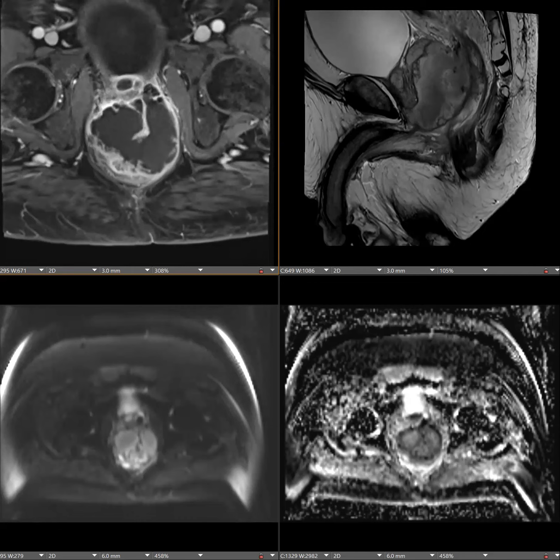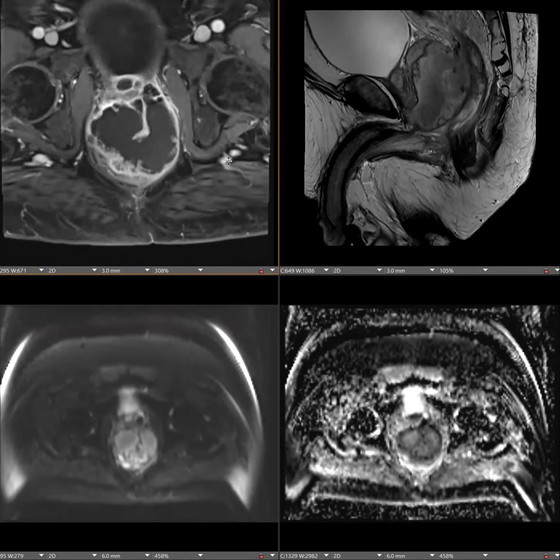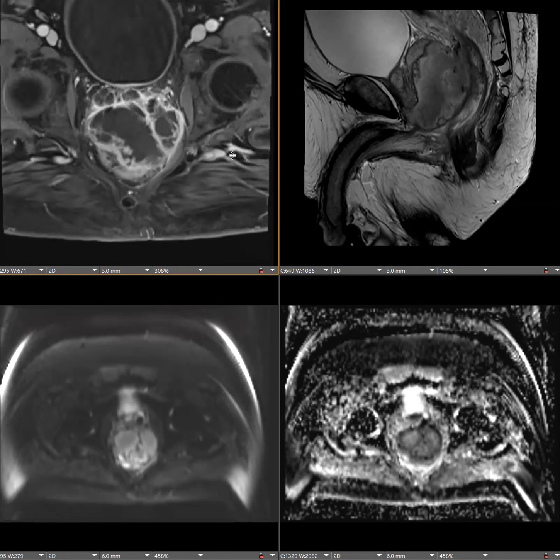So I've never seen one. Wow. I was going to say that post contrast to me just looks like an abscess. So I guess it's kind of in the abscess category, right? Yeah, but he didn't have any fever. He didn't present with any acute constitutional symptoms, no fever, no white count at that point. He just came in because the urologist felt like he had a big prostate for his age. So they said let's do a pelvic MR, prostate MR, and that's how we came down with this.